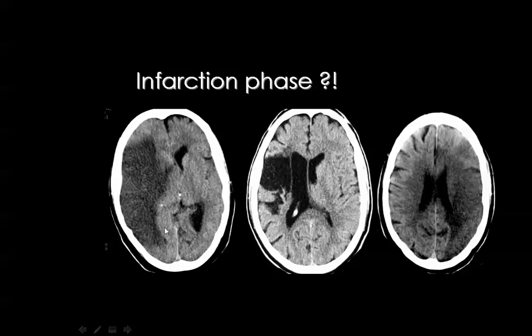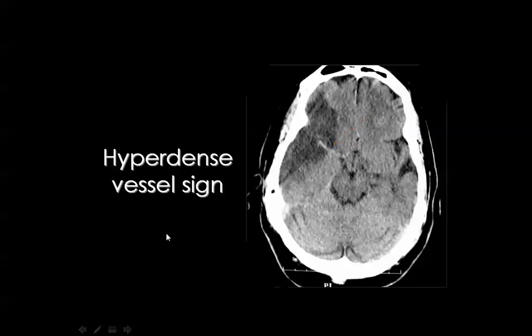You remember that acute infarction cannot produce a mass effect by itself. The infarction produces mass effect on the ventricle like this one by virtue of the surrounding edema. The edema is black and the infarction is also black. So you cannot easily discriminate between the edema and the infarction. But whenever you see a CT scan like this and you can see an infarction like this one, and you see also associated mass effect and ventricular compression, then you should say that this is an acute infarction.